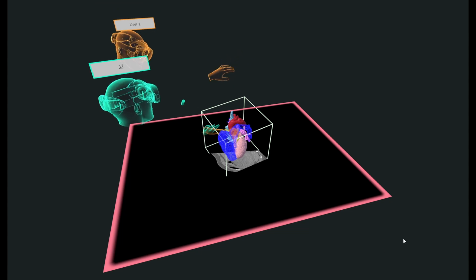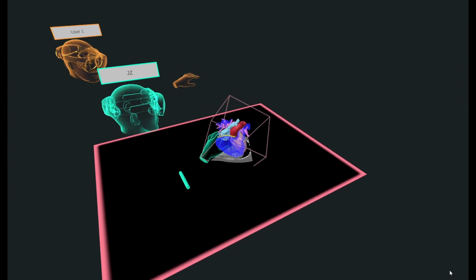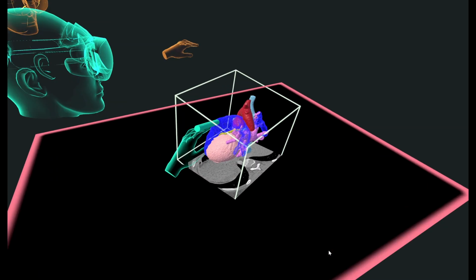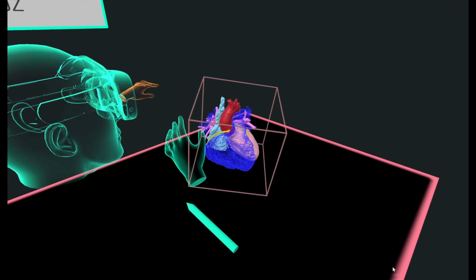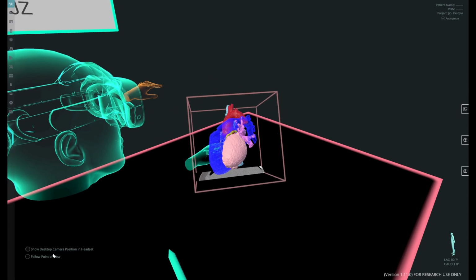All right, so when we're doing complex pulmonary valve interventions, it's very nice to see the relationship of the pulmonary artery with the coronaries and other adjacent structures like the aortic root. So we can see a very dilated MPA there, which is very nice to see. We see the rest of the anatomy really nicely. So that's quite useful.